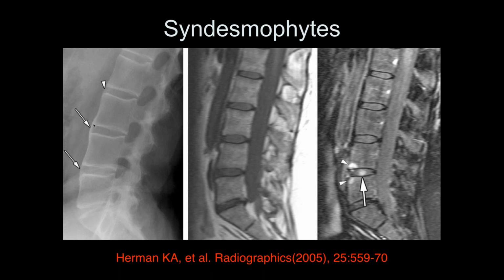Okay. But see, these are vertical ossifications which go along the anterior longitudinal ligament, versus degenerative osteophytes which extend out like this because the disc bulge produces traction injuries at the annular insertion here. The body tries to heal it and develops bone growing out in this direction. This is actually inflammatory disease that involves the anterior longitudinal ligament, which leads to ossification of the longitudinal ligament. Okay. And that's why it's so nice and thin, and that's why it's so difficult to see on an MR scan.